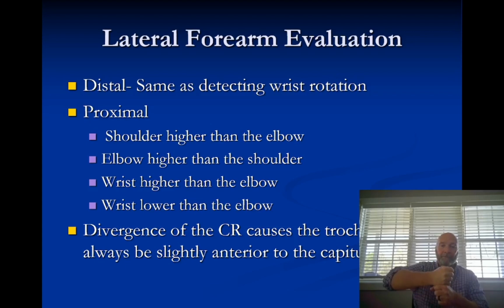But if the one that's elevated is further anterior than it should be, that indicates that either the elbow was elevated or the patient has those great big forearms. If the one that's on lateral is posterior, that indicates the patient's positioning error is that the hand is elevated. So we've got those two things, and we've also got this type of rotation as well.